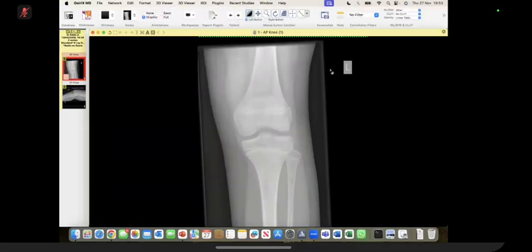Over to you. This is a young 11-year-old with a swollen knee. Okay, sir. So here I'm provided with the frontal radiograph of the left knee of an 11-year-old patient who has presented with some knee swelling. Okay, so I will just quickly have a look at the entire radiograph before giving my final comments. Okay, sir.